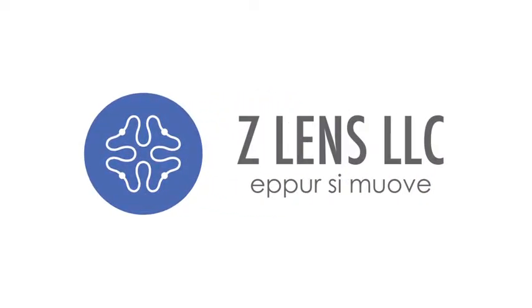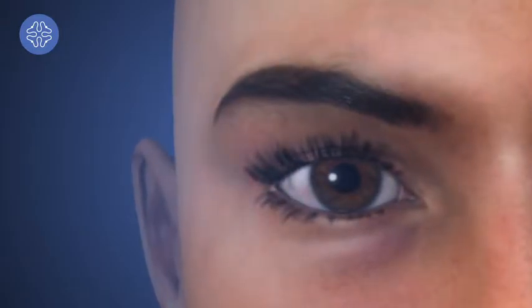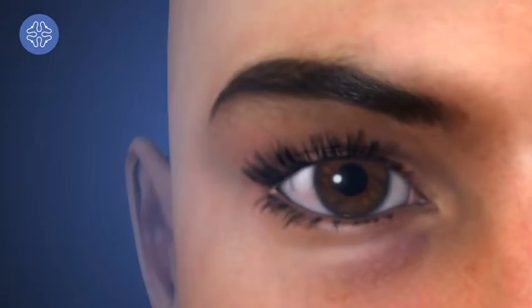Eppur si muove. And yet, it moves. Z-Lens LLC is developing an intraocular lens that replaces the natural lens in the eye after cataract surgery and mimics its movement during accommodation.